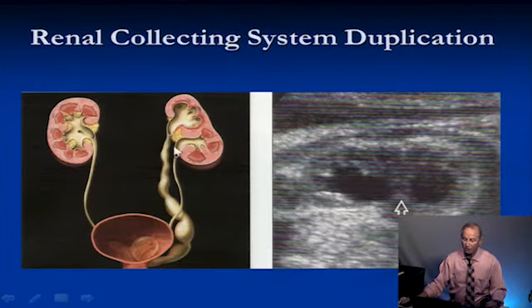Right. Now you have one normal kidney, and this is a duplication. If you have duplication, this means that you have two ureters. How do you diagnose that? You look into the bladder and you find a little cystic area in the bladder called a ureterocele.